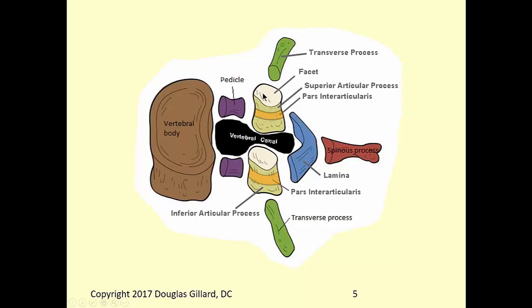Now, superior articular process on the very top has a pad of articular cartilage, has a synovial lining over it, secretes synovial fluid. It meets the one coming from above. This is the superior articular facet of the superior articular process, technically, and it meets the inferior articular process's facet. Together they make up the zygapophyseal joint. Okay, you know that stuff.